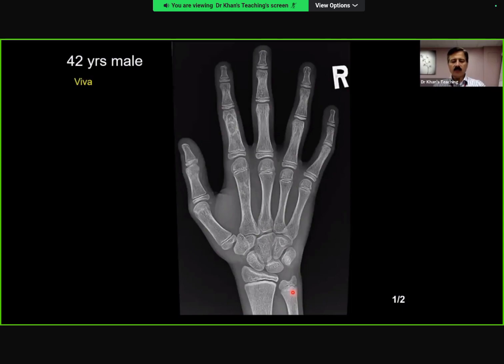Okay, from here we come to another world, and over to you, candidate 2. This is a DP radiograph of a 42-year-old male's right hand. Is it a 42-year-old male? It's an unfused. Oh, that's a typo, so I apologize for that. Well picked up. So 12 potentially, or something of that ilk?